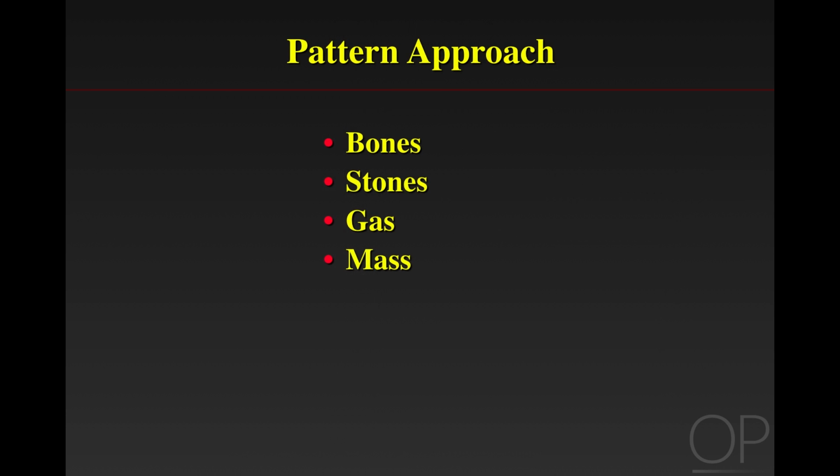So in summary, we have a pattern approach that we can use for the evaluation of the newborn abdomen using the mnemonic bones, stones, gas, mass.